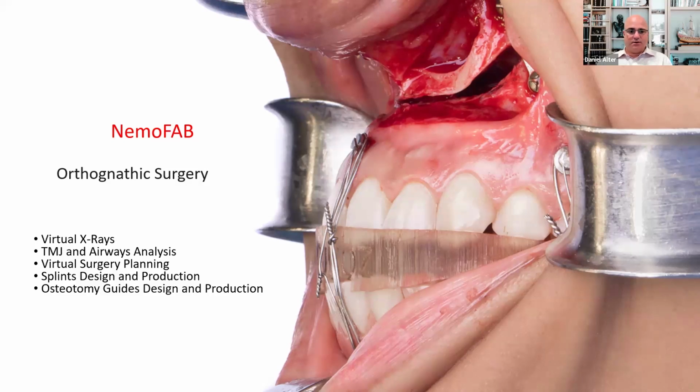So obviously, in the TMJ and airway analysis arena, the ability of moving teeth and moving bone in order to alleviate any kind of airway issues or even TMJ issues is incredibly powerful. It does take a bit of a learning curve to understand and really immerse yourself in that arena, but there are very few players. So truly the opportunity is huge, but it's a very complex and robust opportunity. And there are some good profits and revenues to be made.